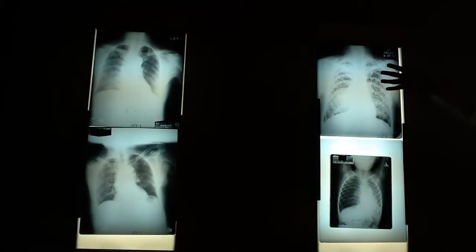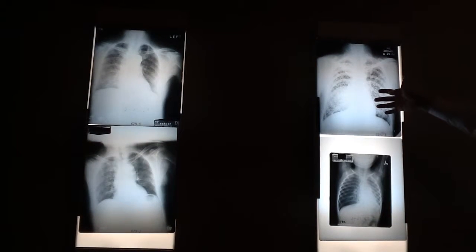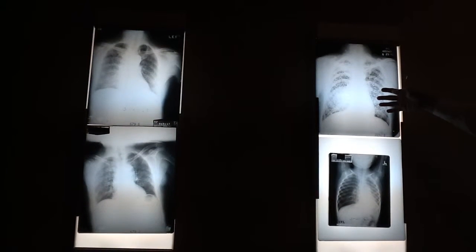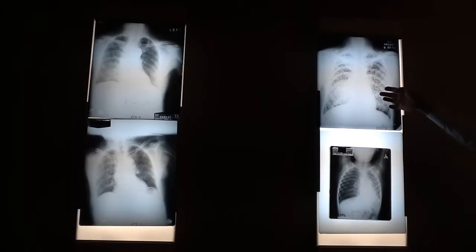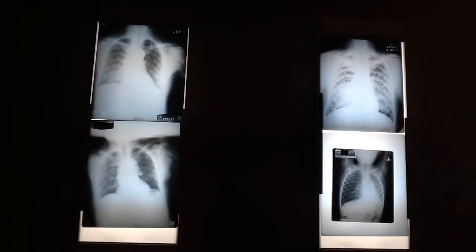So this is nodular, 1 to 2 millimeter, very tiny. This is in the 5 to 8, and I would put most of these around 5, not 8. Well, the 3 to 5 looks just like this, just not as dense as this.